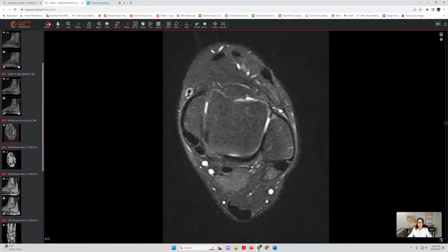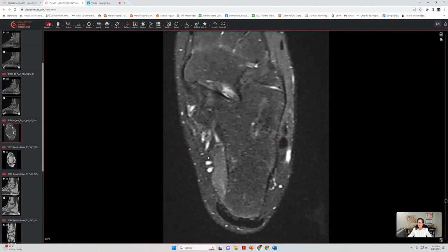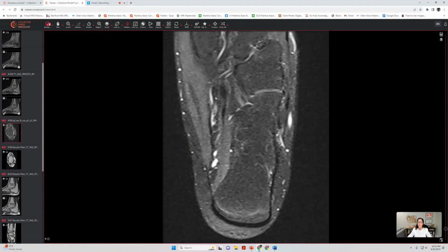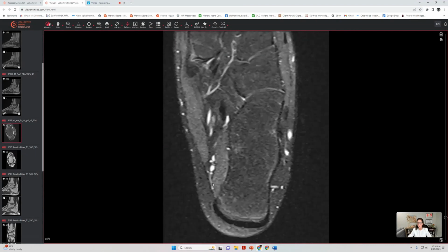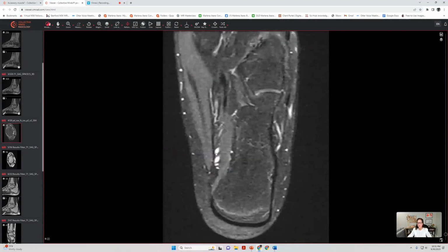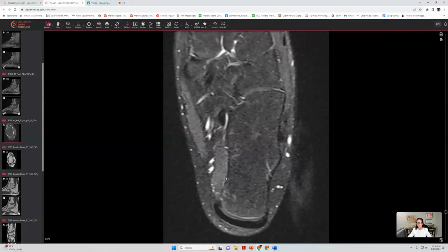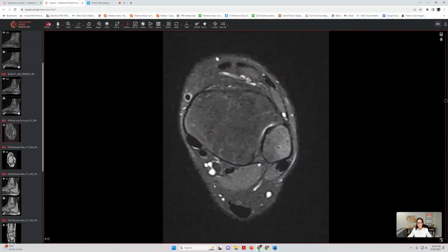And this nerve artery vein bundle travels along the posteromedial ankle through a fibroosseous tunnel to then decussate along a place called the porta pedis. The porta pedis is a place where the nerves, arteries, and veins will decussate, first giving off the medial plantar branch and then the lateral plantar branch. And of course, the medial calcaneal branch was the first branch given off. So the tarsal tunnel is that space.